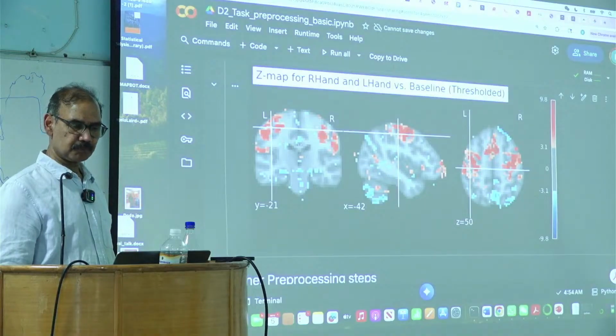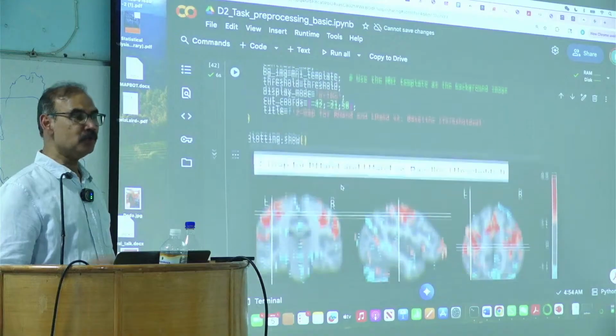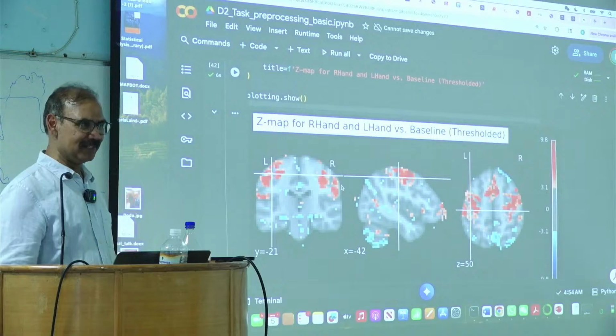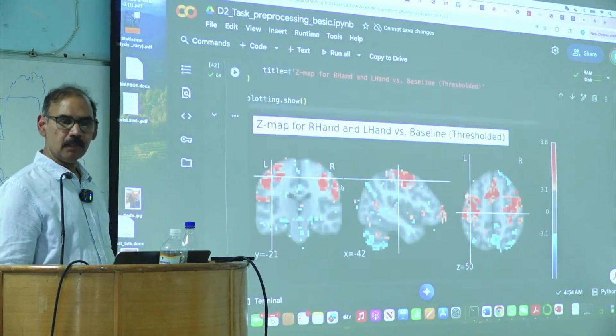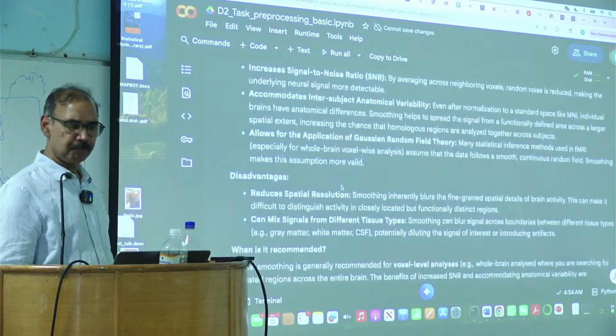This is with a threshold of 3. So when you give your presentation, you have to tell me how you determined your threshold. This is what we have so far.